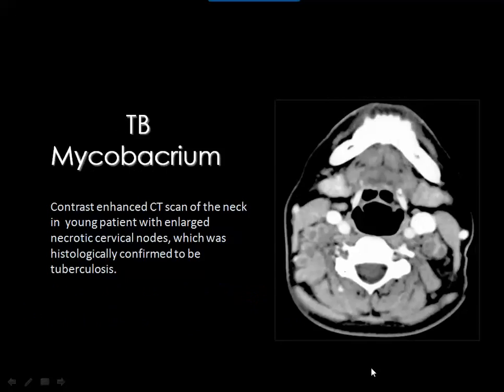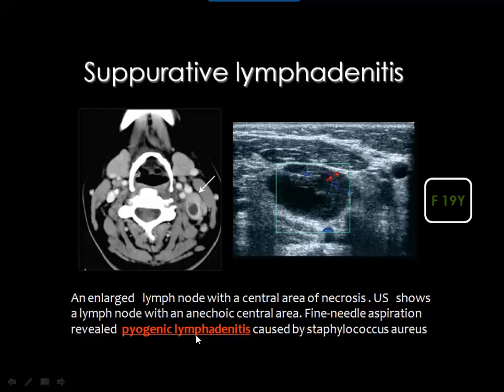and after healing, or in the chronic phase, you get nodal calcification. Then bilateral tuberculous lymphadenopathy, this is an almost pathognomonic appearance for tuberculous lymph nodes in the neck, as well as anywhere like the mediastinum and mesentery, for example.